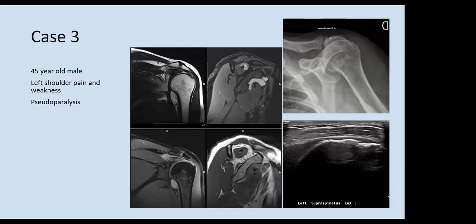Okay, thank you. So if we go back to the radiograph, what would you say about the subacromial space here? There is a decrease of subacromial space. And what does the narrowing of the subacromial space mean? A decrease in OA changes, mostly. Okay, so the narrowing of the subacromial space is actually an indirect sign of full thickness rotator cuff tear.